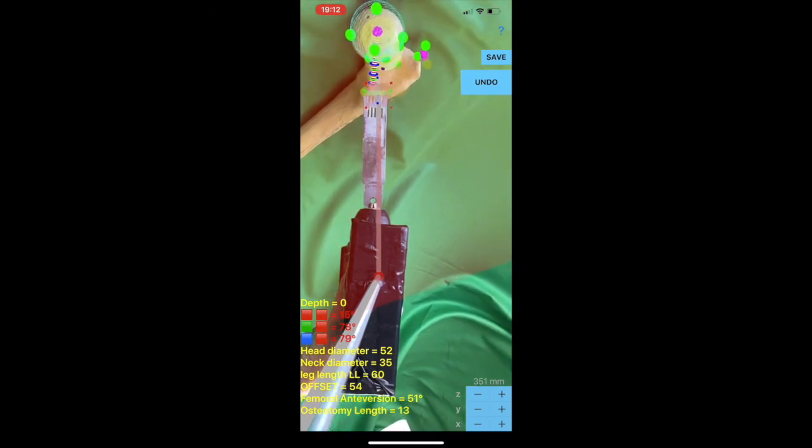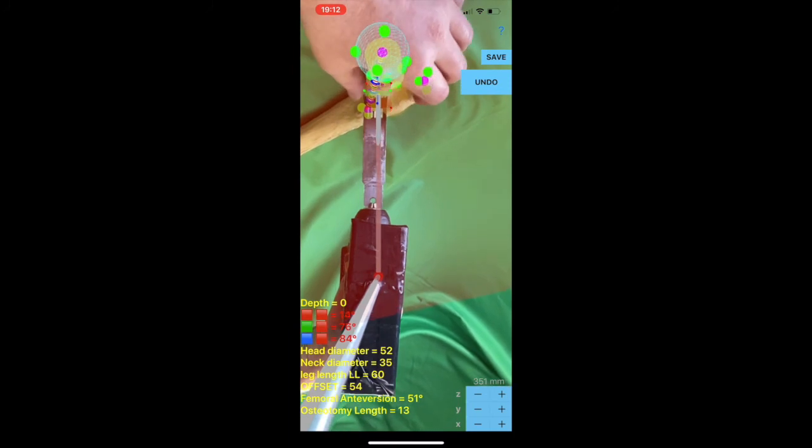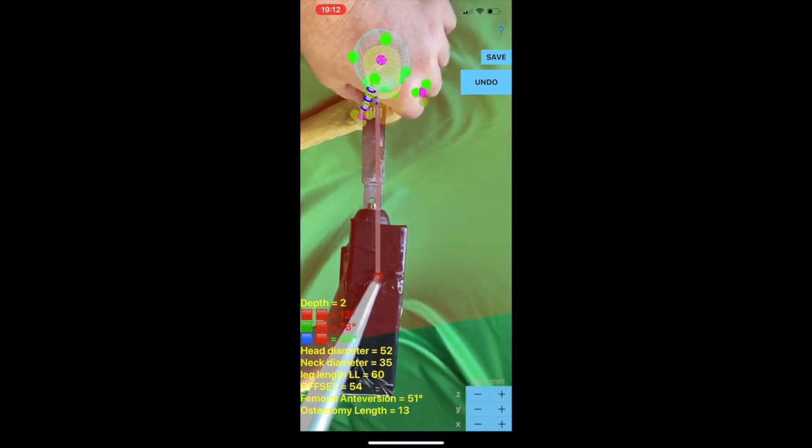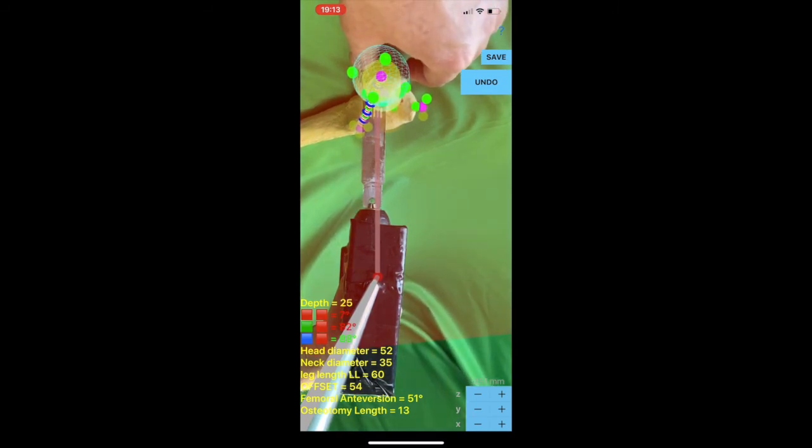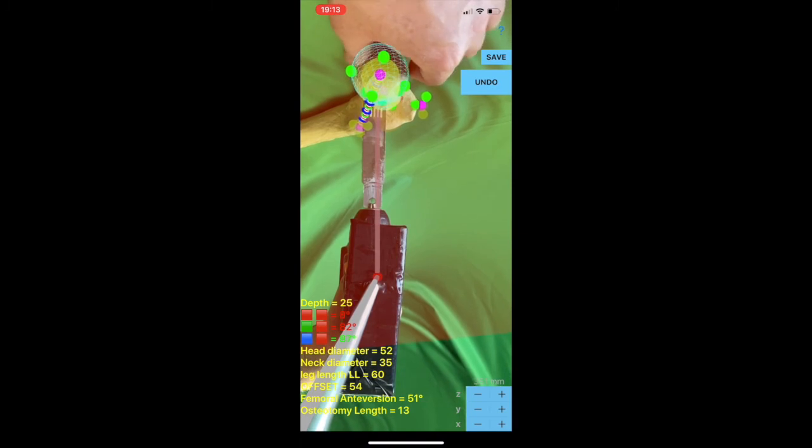Over the screen in real time, three angles corresponding to the direction of saw blade are depicted. For simplicity reason, every color of a plane corresponds to a certain direction. More specifically, the row with red tile by red tile represents the angle subtended by the coronal plane of the blade saw, red, and coronal osteotomy plane, red. The row with green tile by red tile represents the angle subtended by transverse plane of the blade saw, green, and the coronal osteotomy plane, red.